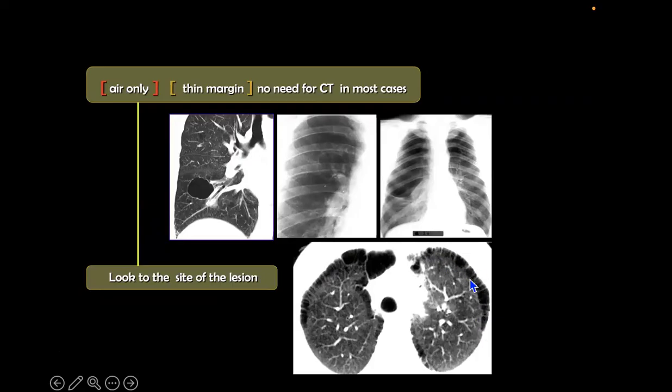So these are air-filled cavities located at the peripheries of the lungs, and we call this paraseptal emphysema. It's typical for smokers, typical. And this is irreversible damage for the lungs. The only treatment for this one who was smoking all the time is lung transplant. He damaged his own lungs, and he will look for lungs that are very precious and will never find them.